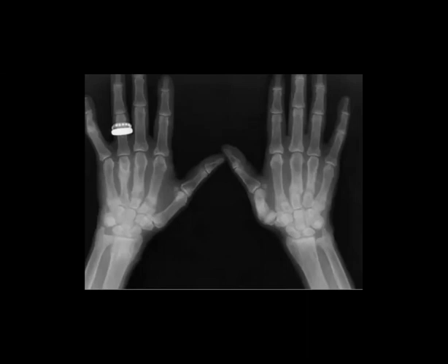I am waiting. I see some suggest psoriasis, maybe, but you know psoriasis has some articular changes. Also rheumatoid will have the same. Hyperparathyroidism maybe, but you know hyperparathyroidism has a lot of criteria that are not typical for this case. Nice, Nermeen, perfect. Osteomalacia, good choice.